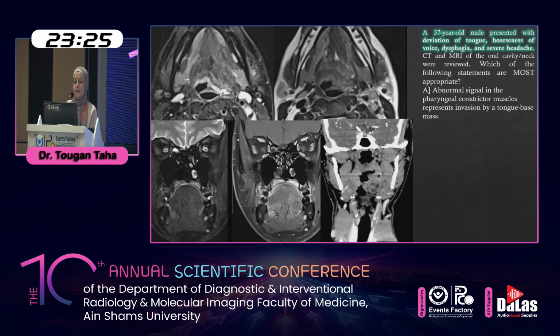My first case is a 37-year-old male patient presented with deviation of tongue, hoarseness of voice, dysphagia, and severe headache. CT and the MRI of the oral cavity and the neck were reviewed. Which of the following statements are most appropriate?